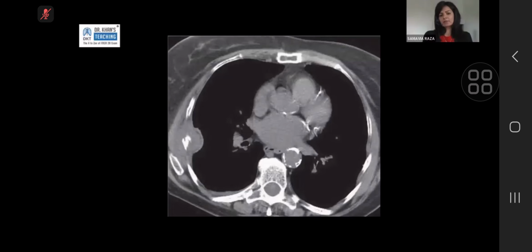Yes. Perfect. Yeah, that's a rib fracture. The hematoma around it is why the fat is preserved. So that's just to drive home the message that the history is very important. There is almost soft tissue opacification, higher density than you would expect with simple fluid, centered around the rib. The rib is broken. So that's a rib fracture with associated hematoma.